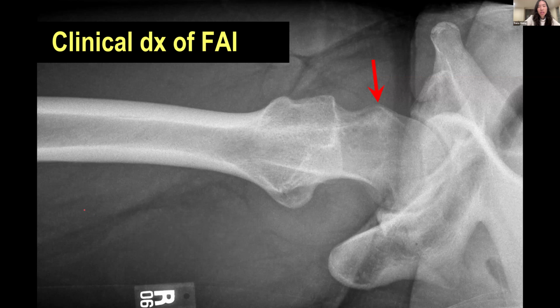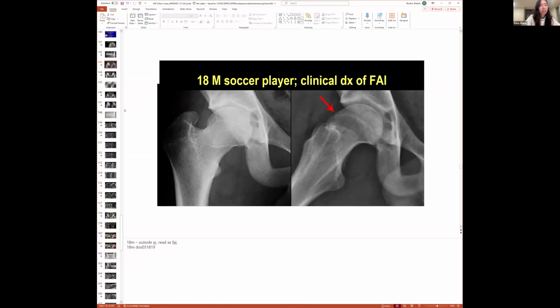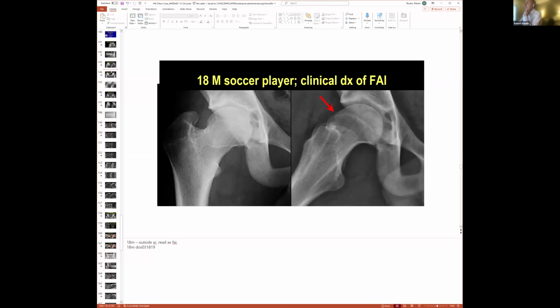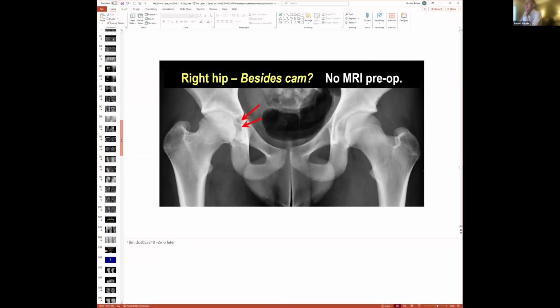And then you showed us an interesting example of bony hypertrophy sequelae after an AIIS avulsion from an AP view. Is there typically one view of the series that tends to be better, or does it just depend? Yeah. A lot of times it's a subtle finding. Let me go back to that one just so I can be showing it.